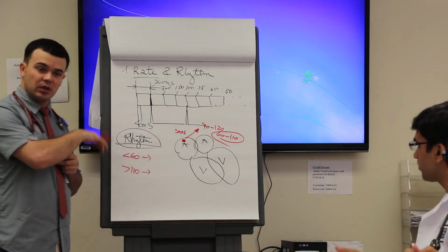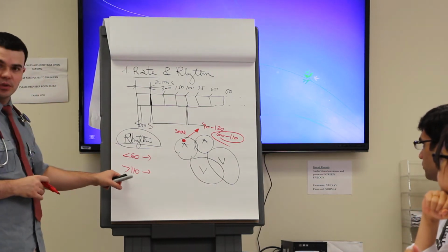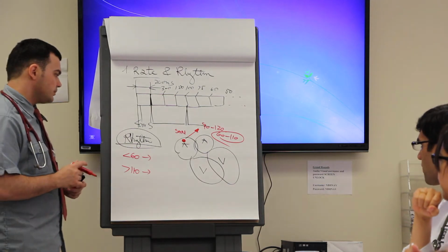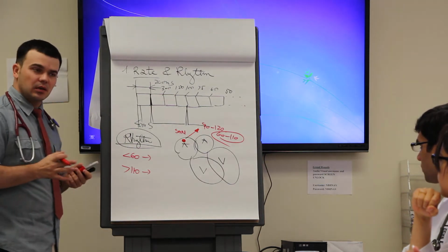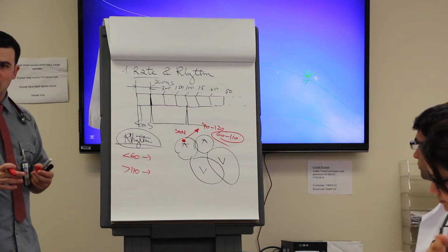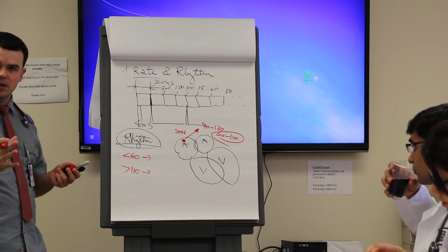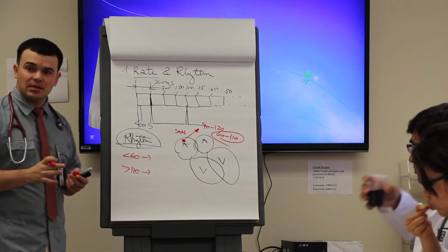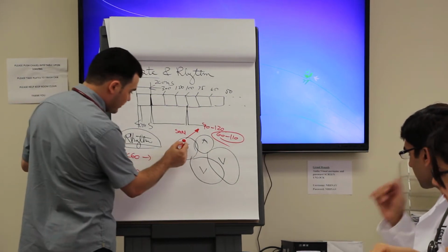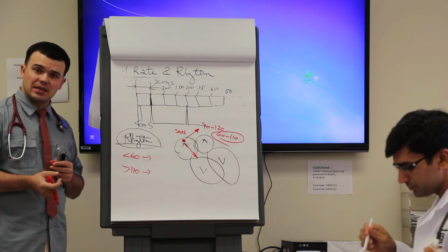We'll speak about a couple of situations when you deal with a bradycardic patient and a tachycardic patient. So to call something sinus rhythm, what do you need? You need P waves followed by QRS, regular, with an axis that points out the fact that this is coming from above. Very similar to the QRS axis, if you think about it.